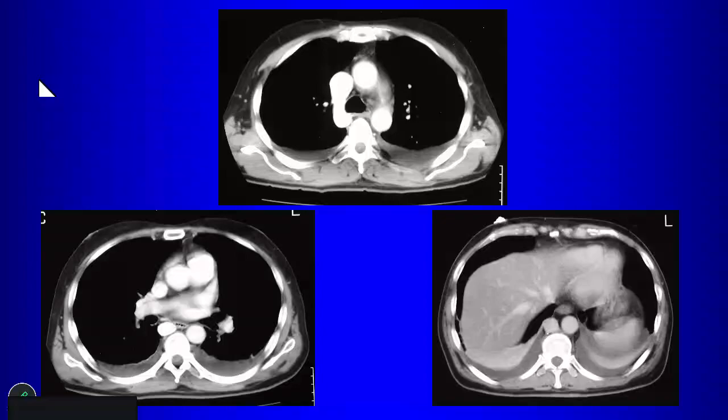And in this case, the answer is, how do you recognize that? There's no intrahepatic IVC. There's this vessel posteriorly, which represents that azygos continuation, and it goes up. It goes all the way up to a dilated azygos arch that drains through the superior vena cava. But the key is that there is no intrahepatic inferior vena cava.